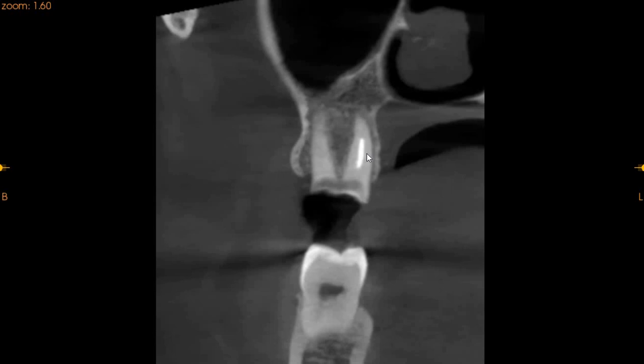We do not have the exact Turkish brand of the implant, but we will place a generic implant and will also share the implant planning report, so a better understanding of this area can be gained by our kind doctor.